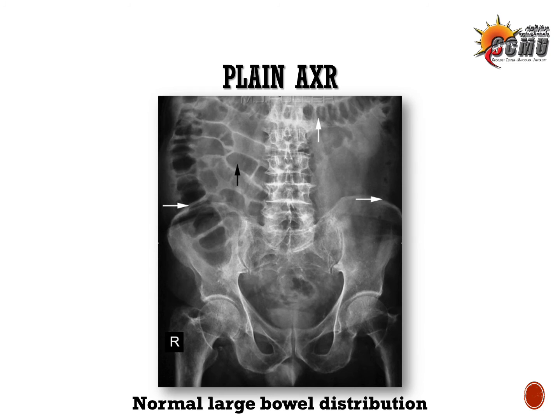Okay, so how could we know whether this is normal or abnormal dilatation? You should have a ruler and you should measure the dilatation, the segment dilated, from one side of the wall to the other. If it follows the 3-6-9 centimeter rule, then this is normal dilatation with gas shadows. If it is beyond that, beyond 3 for small intestine, 6 for any part of the colon, and 9 for the cecum exclusively, then that is large bowel obstruction or small bowel obstruction according to the part dilated.